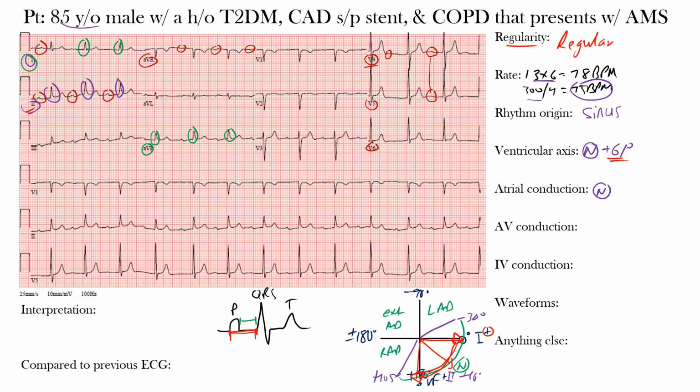All right, so let's take a look here. Where can we see an easy way to point this out? Okay, so let's look at this one right here. We're looking from this P wave up until the beginning of this QRS complex. Notice that within here, you already have more than 200 milliseconds. Remember, from one thick line to the next represents 5 of the small boxes, which are all 40 milliseconds each. So if you multiply 40 milliseconds by 5, that's 200 milliseconds, okay?